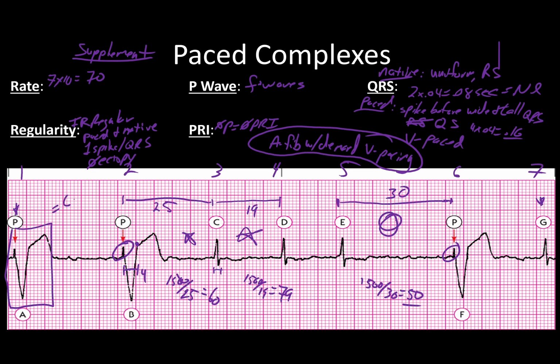And so that causes the cell-to-cell conduction. And that's why you wind up with such a wide and tall QRS, because of that cell-to-cell conduction that occurs through there. And you'll even note that you have inverted T waves, that the QRS goes this direction and the T wave is often opposite of that because of the cell-to-cell conduction.